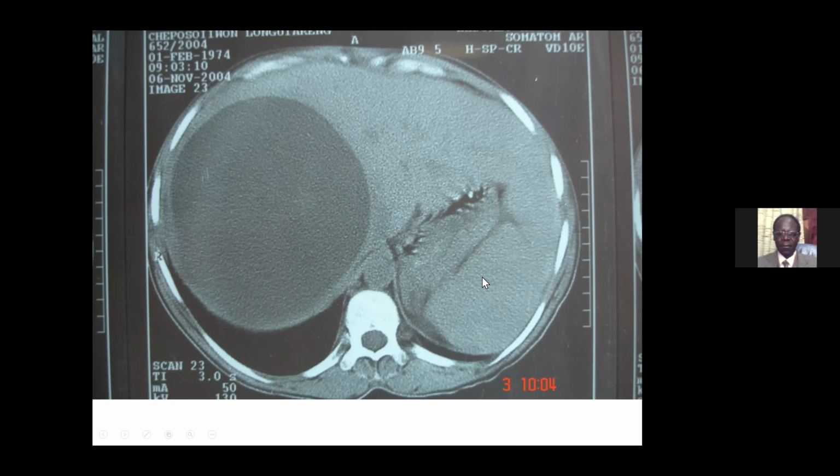Yeah, so as we were doing the topogram, we noticed that there was another lesion in the right lung. So we did a CT of the chest too. And what we saw in the lung gave away what this is.